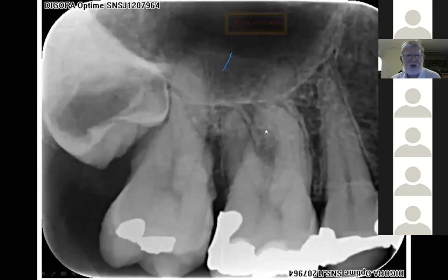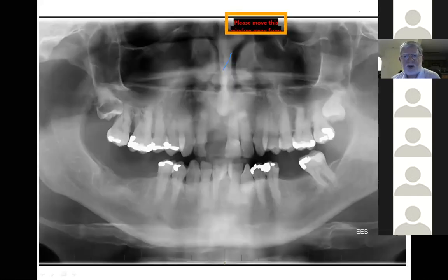And what we saw there now was an 8, and this was now starting to dissolve away on this patient. So you can see we've seen many examples of this, and there he is on the OPG. The 2-8 is fine. This one here is just starting to resolve away. It had become infected. I think there may have been an opening there, and this tooth needed to be removed on that patient.